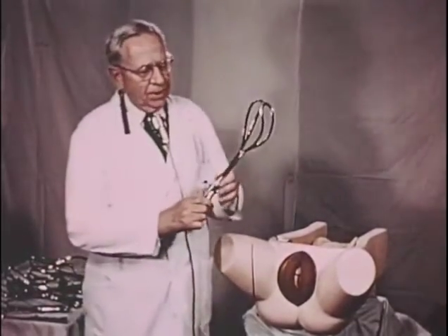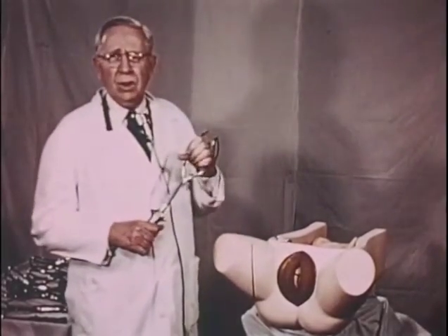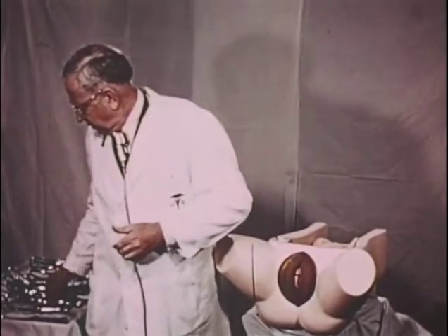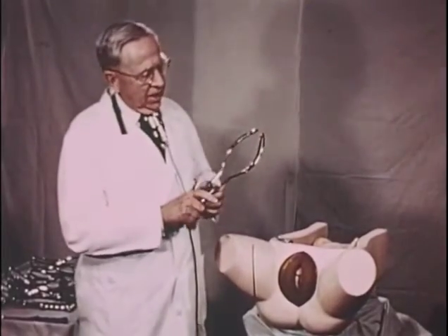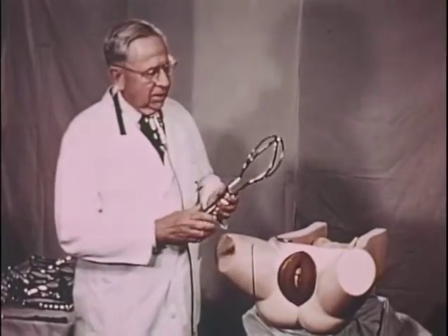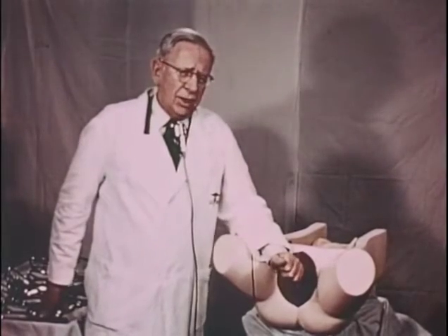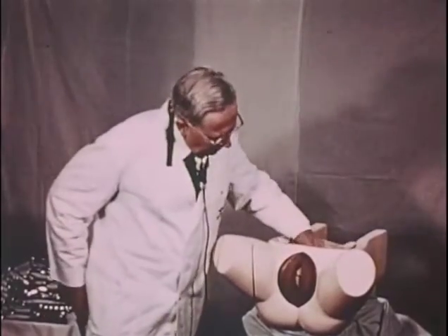The instrument with the overlapping shanks has a short, round cephalic curve, which tends to fit round, unmolded heads. And this particular instrument is the Elliott type. The instrument with the separated shanks has a long, tapering cephalic curve, and this fits molded heads best. Here we have the Lee modification of the Simpson type. So for a fixed rule, we say the Elliott type of forceps for round heads and the Simpson type for molded heads.